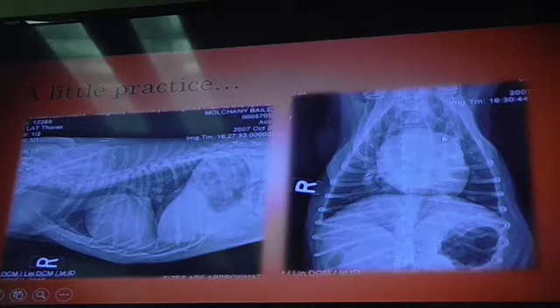A tail one can anatomically go that far up, but what you're looking at here is just the vertebral column. No, okay, that's not it. That's all the bones there. You're looking at the ribs coursing into the sternum. That's what you're seeing here. This soft tissue structure that's coursing out here is a combination of the mediastinum, the descending aorta, and all of that stuff that lives on midline. Okay? Everybody understand this lateral view now?